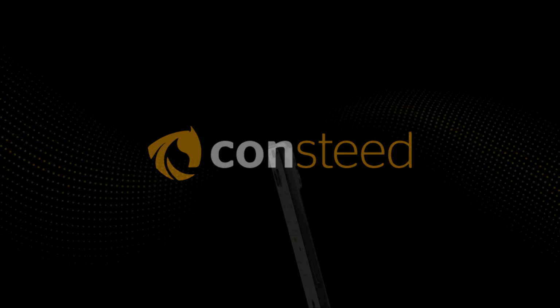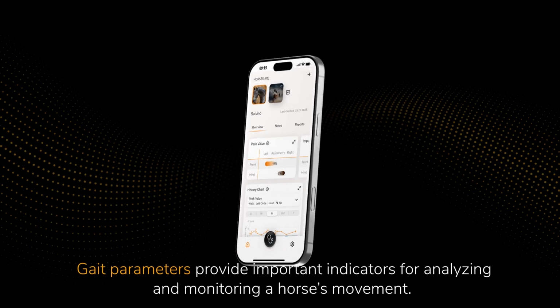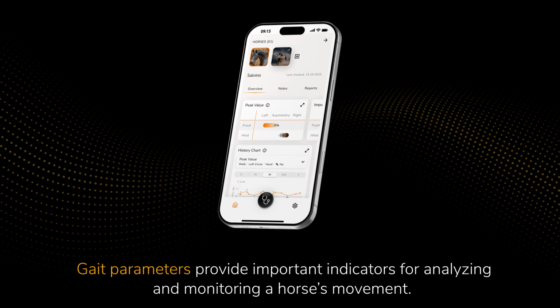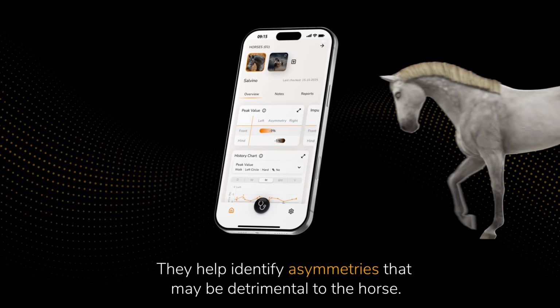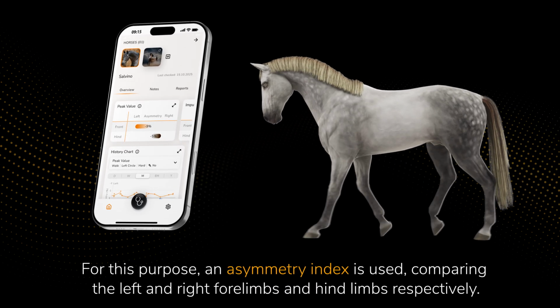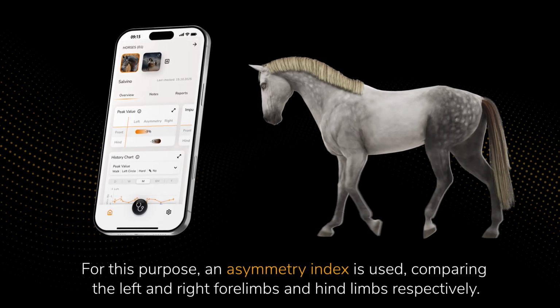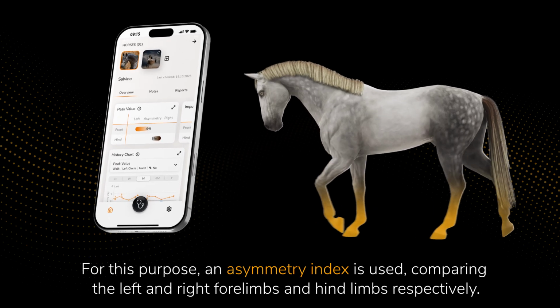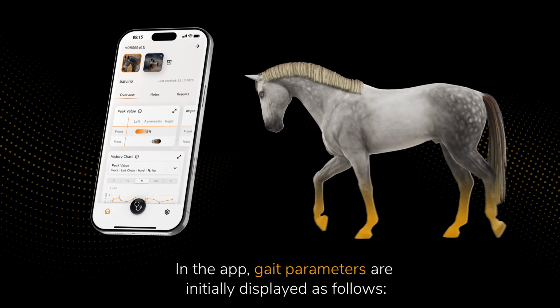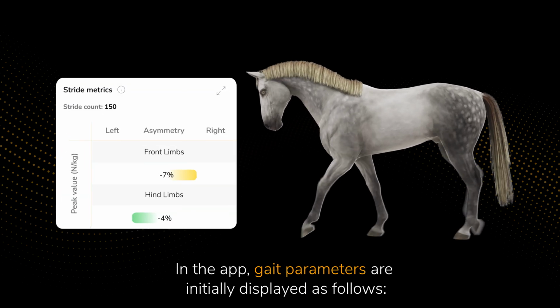What are gait parameters? Gait parameters provide important indicators for analyzing and monitoring a horse's movement. They help identify asymmetries that may be detrimental to the horse. For this purpose, an asymmetry index is used, comparing the left and right forelimbs and hind limbs respectively. In the app, gait parameters are initially displayed as follows.